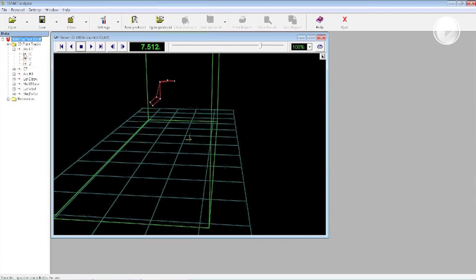So basically, the movement of each marker in the volume that we calibrate is referred to the absolute reference that is over here. Reference that is here as well as a folder. We can find the reference of the lab, of course, the three components, and the origin of this reference. Okay, so this is what we find once we open a trial that we have to analyze.